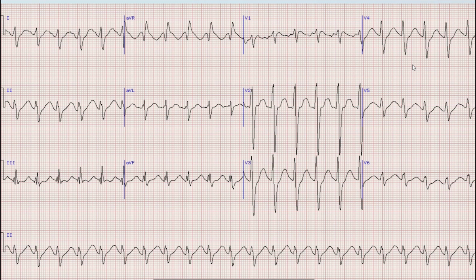First thing which we look at on an ECG is rhythm. For rhythm, we look at the presence of P wave in rhythm strip. As we can see that due to presence of tachycardia, we are not able to appreciate any P waves in rhythm strip. However, there are prominent P waves before each QRS complex in lead AVL.